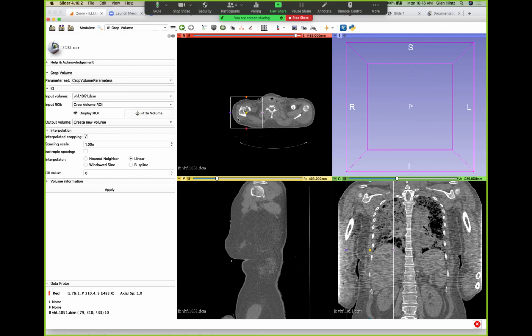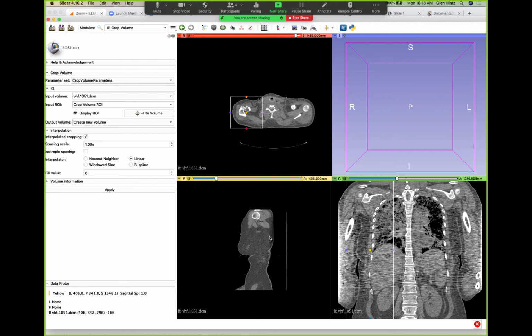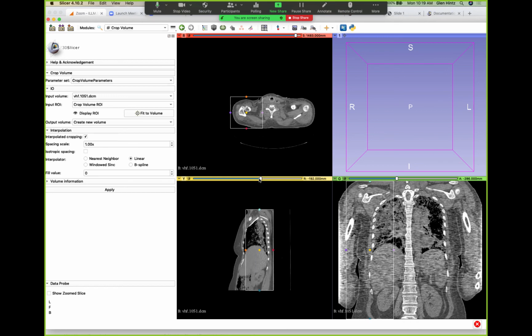And you have to be careful, because if you miss the dot, it changes the contrast, which is not a big deal. You can always go back and change it. So for example here, now it looks to you like, okay, well, there's no dots here. What you have to do is go back and find them. There you go. Because I only did the left side, when I'm in this, I'm actually not looking at the right side here. So when I go across the midline, now I'm looking at the left side. So now I can adjust those dots. Okay, and then you continue through that lesson.